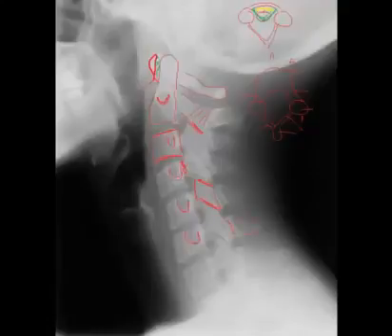Now, you all will notice this very conspicuous white line here on the posterior arch of each vertebrae. This is the spinolaminar junction. This is actually the junction point between the lamina and the spinous process. Now, because the bone is so thick in that location, it's very radiographically dense, and so we see that line very well. If that line is not visualized, let's say on this bird's eye view, there's a midline defect.